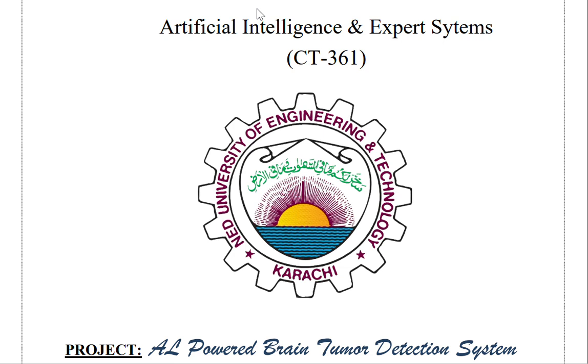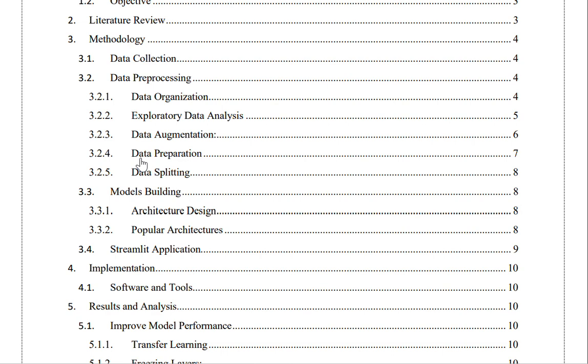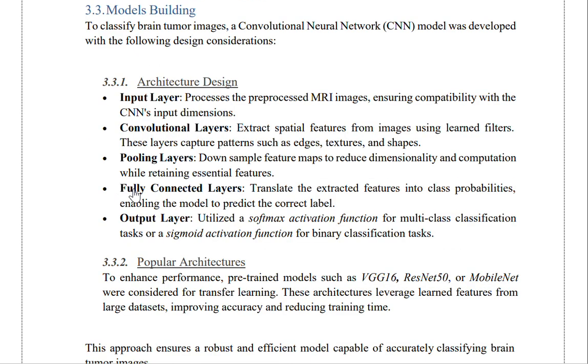In this project my part is model building and training, performance optimization, training accuracy and loss. So let's dive into the model building section. I am going to walk you through the model building phase of our brain tumor detection project using convolutional neural networks, or CNNs.